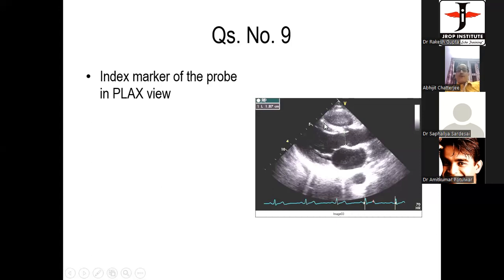Some people call them D1, some people call them S1. Little variation. So the D1 is quite different. It supplies the lateral wall of the left ventricle. S1 and S2 go into the substance of the septum, but they are not visible in the naked eye examination. This is not septum. This is anterior septum. What you said was good for septum, but as soon as the aorta opens up, this becomes anterior septum. Anterior septum is supplied by LAD and that is supplied by RCA. Okay, sir.